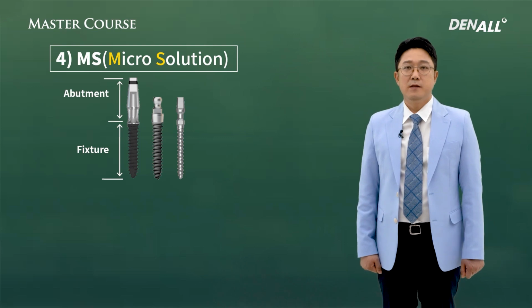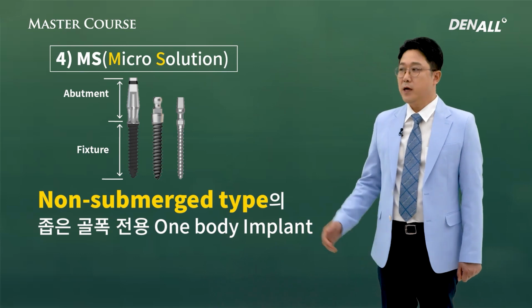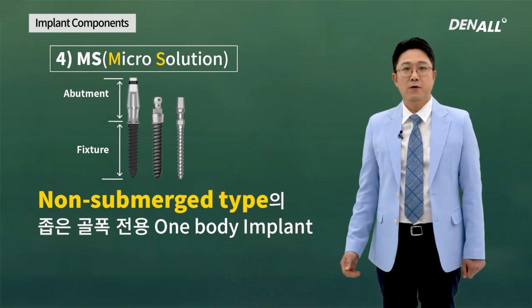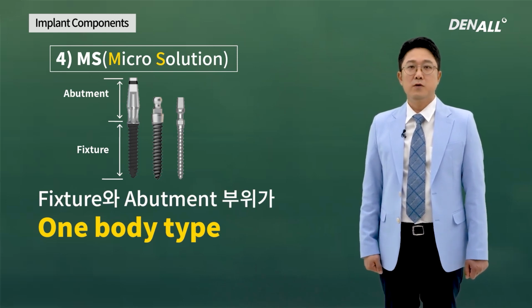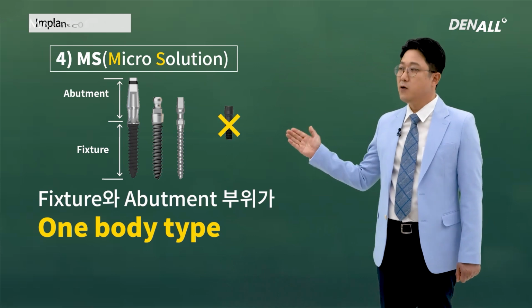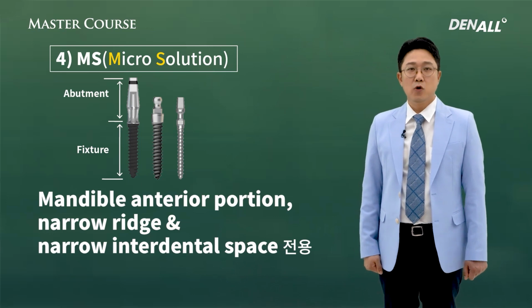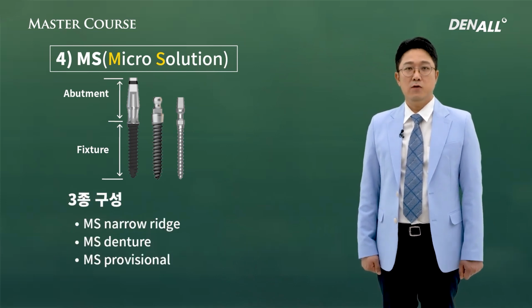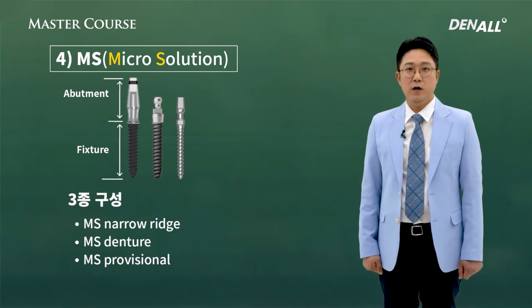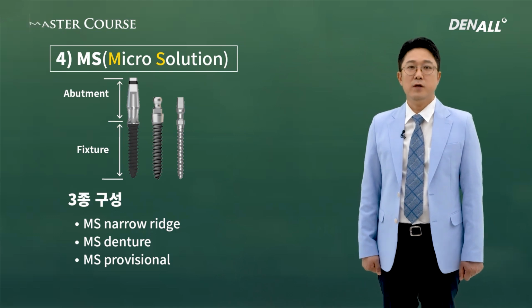First, it can be used for narrow ridges like lower anterior, and as shown, fixture and abutment is one piece, one body type. Therefore, there's no necessity for a screw that connects abutment and fixture. Like lower anterior, in the case there's narrow ridge and narrow interdental space, it is very useful. Depending on abutment shape, you can create crown accordingly, and you can use it for supporting denture and for temporary teeth.